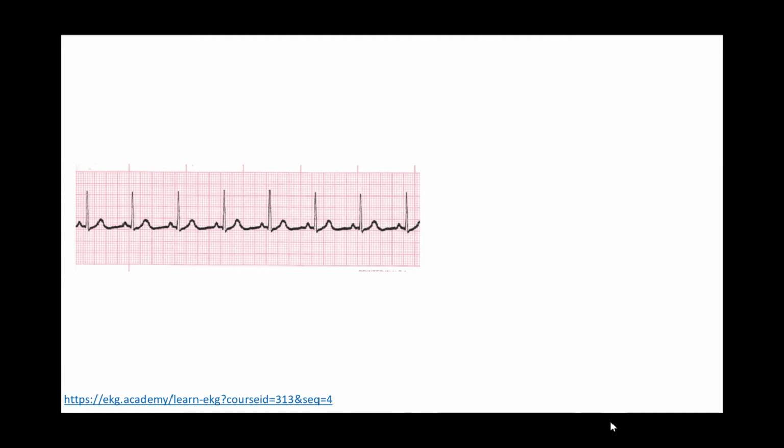In order to do this, I'm going to look at these two QRS complexes. It helps a lot when the R wave lines up with one of the big box red lines. Unfortunately, it doesn't here, but we'll just try to eyeball how many big boxes are between these two QRS complexes. So I'm going to say there's 1, 2, 3, and just about 4.